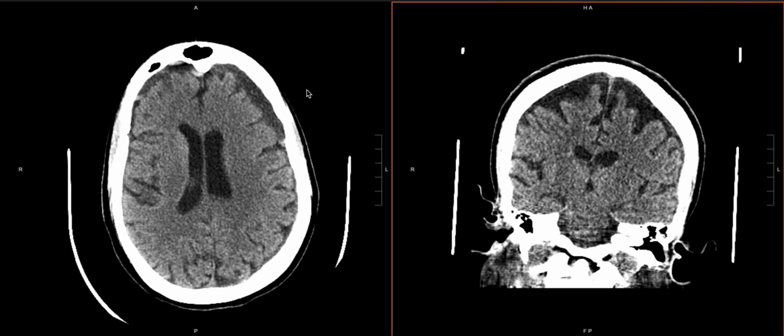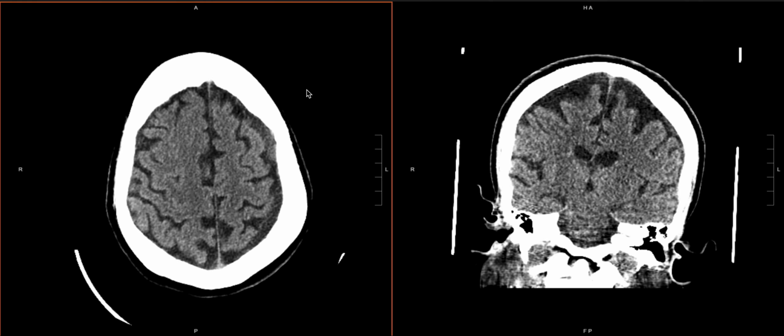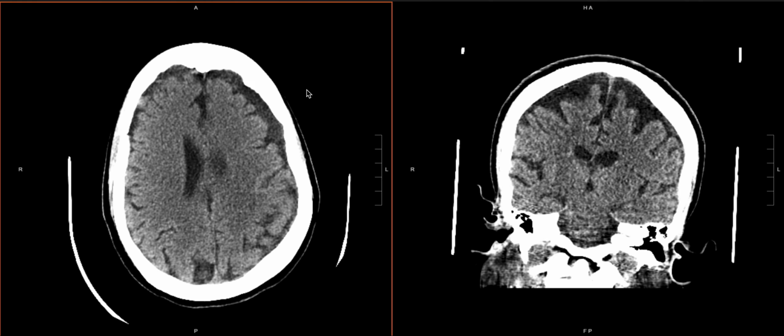This is the next case in our case series. And this is an interesting case for a number of reasons, mainly because it helps demonstrate the appearance of different ages of blood products on the same study. And this can be really tricky because you can have patients who have what looks like something chronic going on, but there can always be an acute subcomponent.